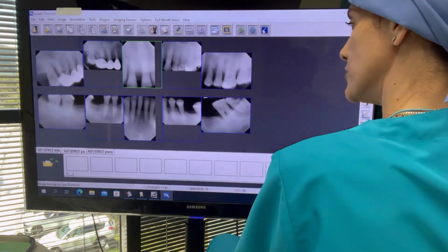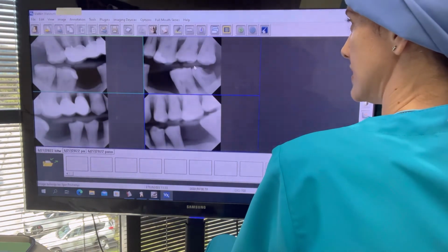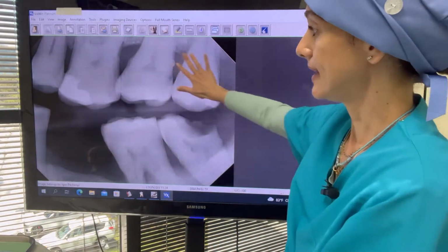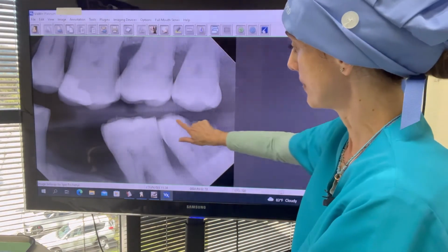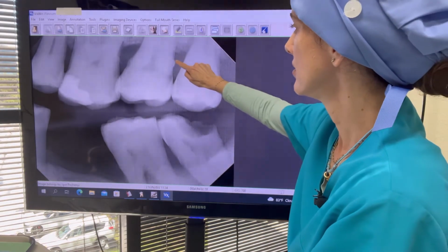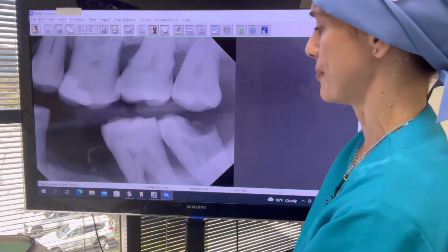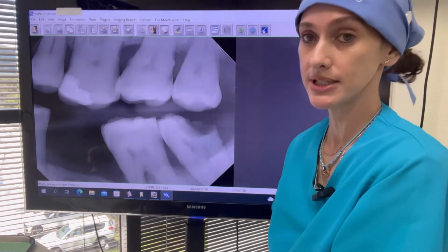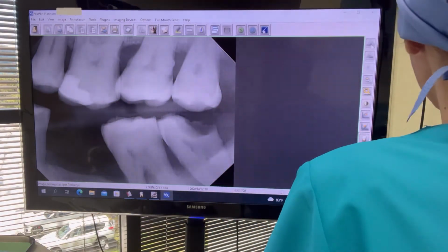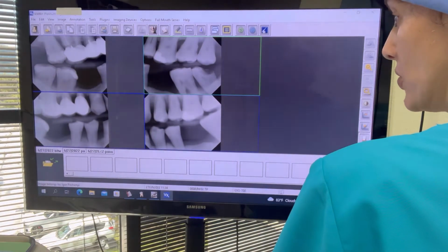Oh, we're going to go to the bite wings, and just to complement a little bit what we were saying before, this is the left area. Again, that break, you can have another angle of view here, and you can see all the tartar and also the bone loss on the top areas. Also, very importantly, we have to replace those missing teeth so that he can have better biting, better occlusion.